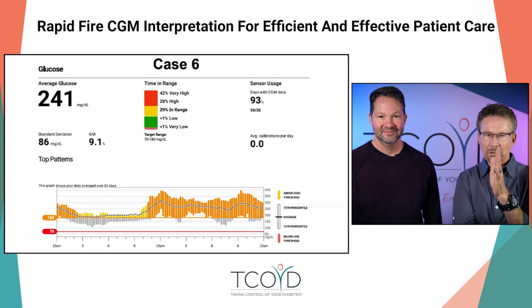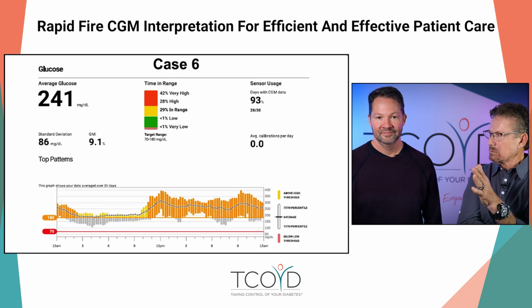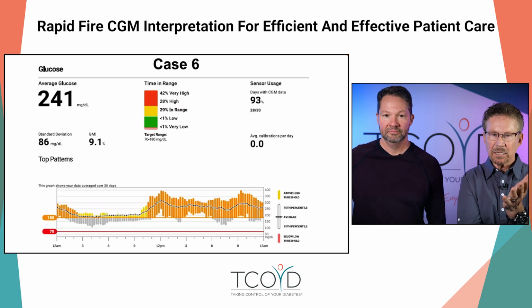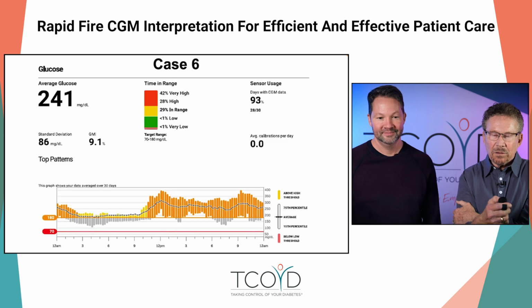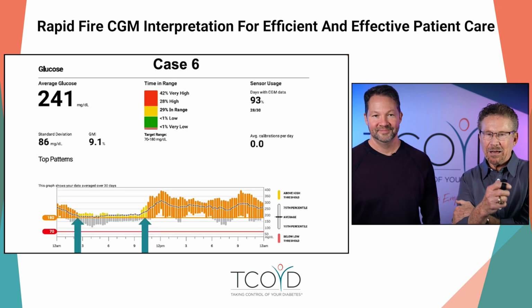But Jeremy, you're doing awesome. I think the key here is what part are you going to focus on during the visit? I'd focus on the time of day, and expect them to guess what they got. Yeah, that's it. You say, this tells you they're doing great at night, but something happens at that second arrow.